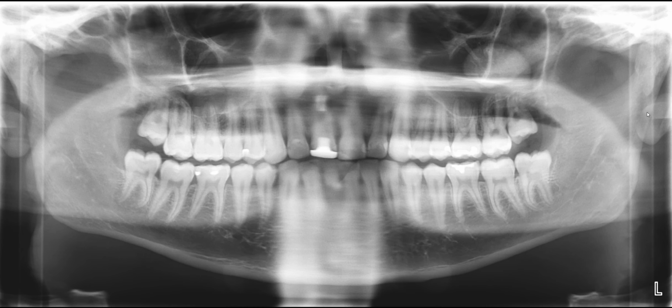Okay, so you have enough radiographic features to determine what this is. Can you guess what this might be? Another thing that might be helpful to know is the vitality of these teeth, right? Whether it's vital or not could help you to determine this opacity one way or another. It may help you to lean toward one or the other diagnosis. But given that this patient is asymptomatic and the vitality of these teeth is completely normal, what would you say this is?